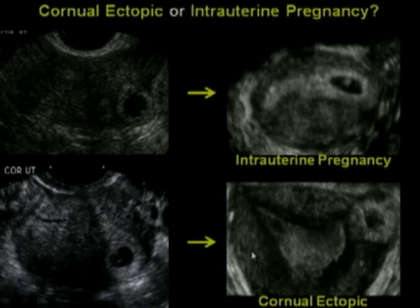So I've come to the end of the tour. I've looked at some of the basic rules for diagnosing ectopic pregnancies, some of the pitfalls in diagnosing tubal ectopic pregnancies, and some of the rules for diagnosing unusual ectopic pregnancies. I hope that it's been very useful to you in seeing how we make the diagnosis of tubal and unusual ectopic pregnancies. Thank you.